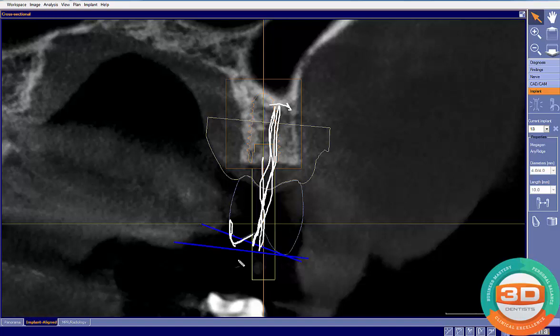Again, minor things that I look at since we have all the technology. The next thing that I would mention here, and this is a personal preference, is that this particular implant can be sunk a little bit deeper to gain a little bit more of a platform switch and a subcrestal position to allow for, let me get rid of all of this and then redraw here. Also to consider is our emergence profile, like so. And I'm not terribly in love with this emergence profile, and we may not have enough room to develop that emergence profile.